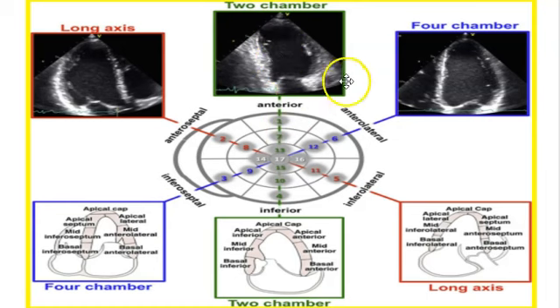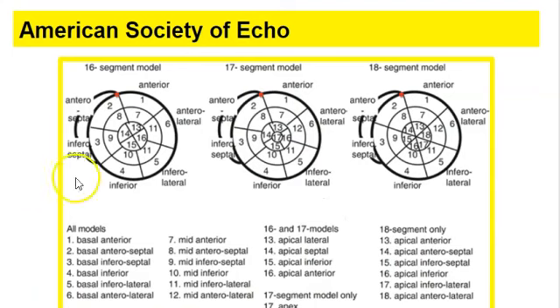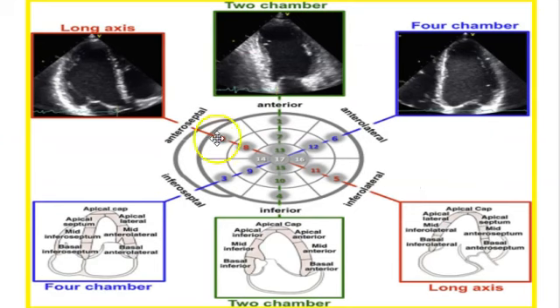This would be the two-chamber view, for example, right in the center. We're going to cut right down through the center of the heart, and we're going to be cutting through 1, 7, 13, and so on and so forth. And if you look at that, right here, 1, 7, I know they don't have 11 in there, but 13 and so on. But you can see how that comes right down here. It's actually, that is a 13, is it? 1, 7, 13, 17. So this particular cut goes straight down through the two-chamber view.